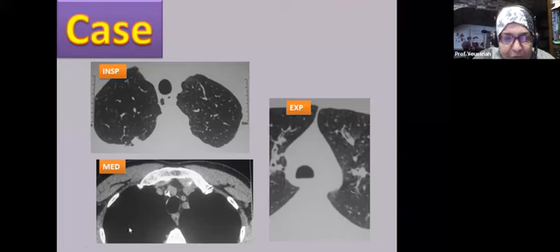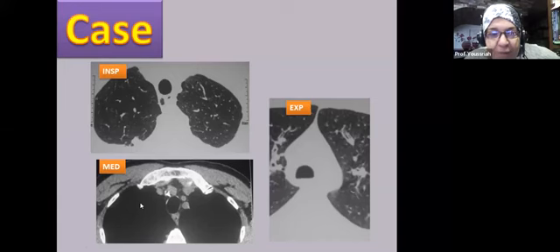Now, very important here, look at the mediastinal image of the normal trachea. You hardly see a wall, even with calcification, which is related to aging. The anterolateral aspect of the trachea is cartilage that by age will start to calcify. Okay, so it is just a rim, very thin, hardly visible. This is very important because anything else is a pathology. So the trachea has a uniform caliber along its whole course, and these are its configuration in inspiration and expiration, and this is its appearance in the mediastinal window.